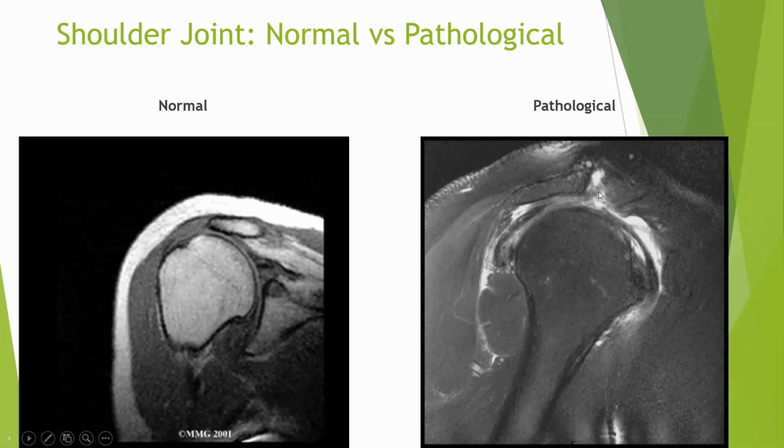A full thickness rotator cuff tear, and that is causing a lot of inflammatory response with fluid, which is not only accumulated in the localized area, but is also pervading the glenohumeral joint in front and also within the joint right over here. So the entire area has fluid. That's why it's so bright and white, because there is this rotator cuff over here, or supraspinatus, to be more exact or accurate. There is a full thickness tear in here.